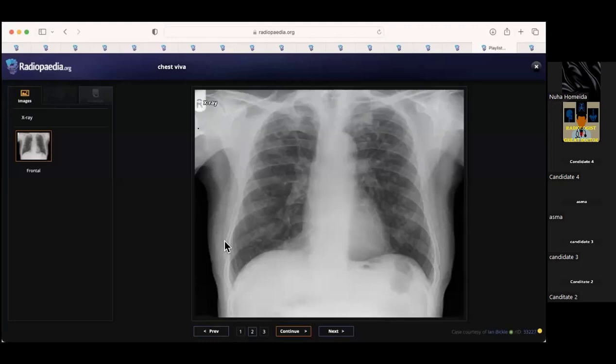Okay, just going back, you said that the changes are reticulonodular. Is there any zonal predominance here? Can you see it much more in the upper, mid, or lower zones? They are in no zone of predilection. I can see nodules in the upper, mid and lower zones. But predominantly, where are the changes? Predominantly, maybe in the mid lung zones.